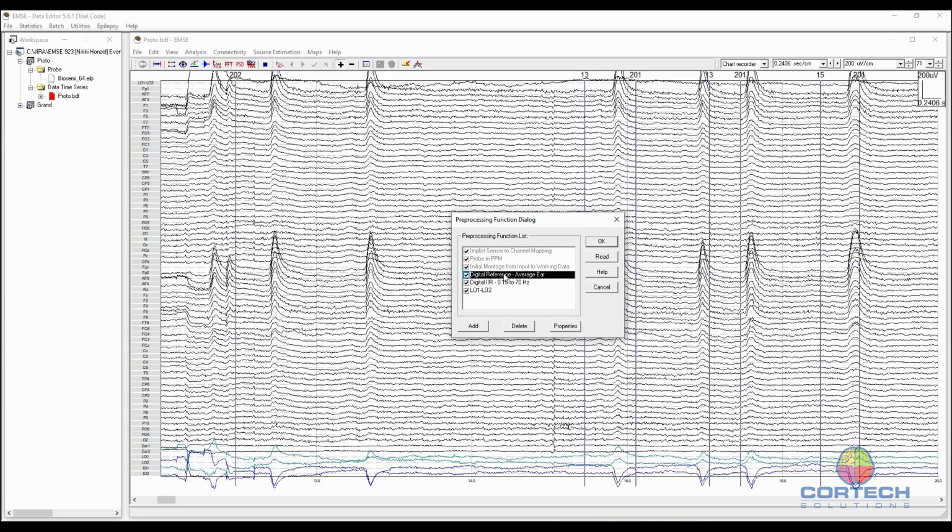As a general rule, we don't change anything there, but it's there to remind us of the history of what was previously processed in the data. These 3 right now are showing dark, and we can turn them on and off right now. So they're being applied live.